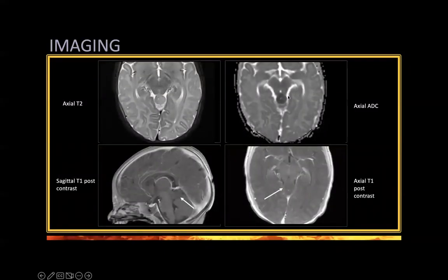But we keep looking and we have something else here. Again, a small nodule in the brain, again showing diffusion restriction, but no enhancement. Now, if we consider this to be a tumor and we come from the adult neuroradiology world, a tumor that does not enhance in an adult is most likely either benign or low grade, or maybe can be grade 2, grade 3. But it's very important to consider, and this is my teaching point, that in children you always trust diffusion first, and diffusion means high cellularity, and such a dark diffusion is typical of embryonal tumor.